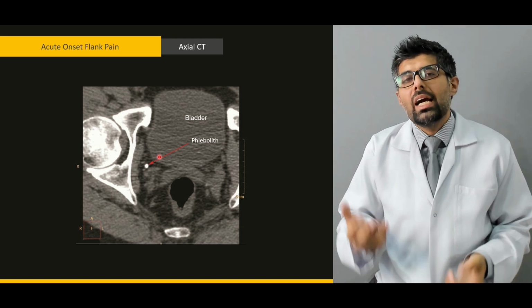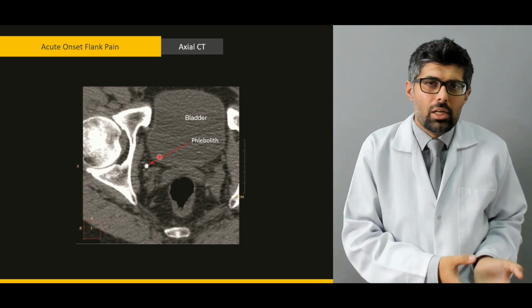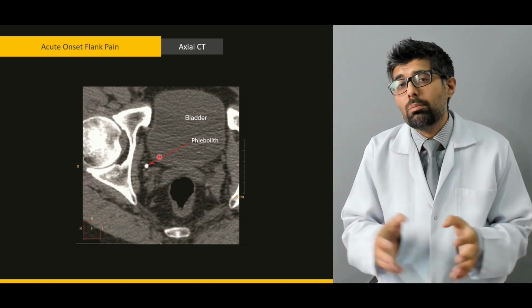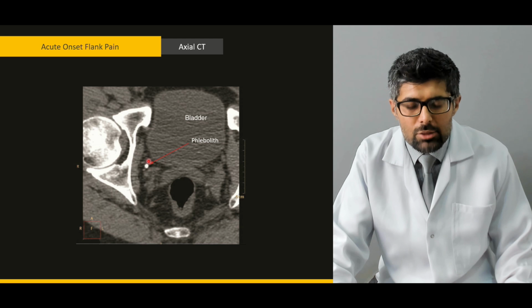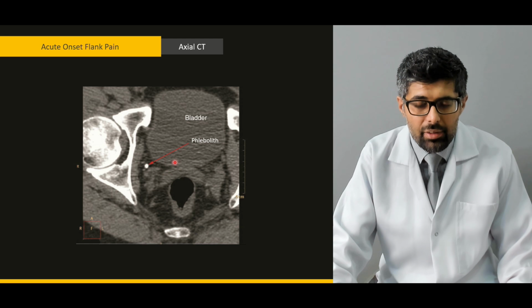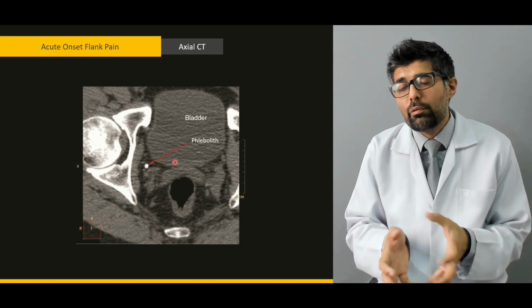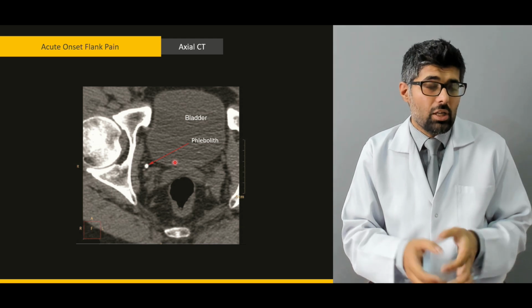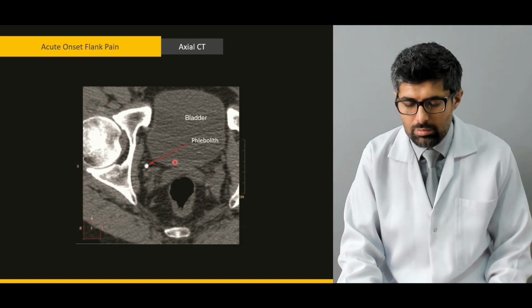Whenever we do an axial CT scan, they look exactly like a renal calculus, but they are not in the same place. In order to differentiate both, the phlebolith has clear margins and is spherical. They are not hazy, they're clear. But because of the soft tissue haziness around the renal calculus, and the dilated ureter in which it has lodged, its appearance is different.